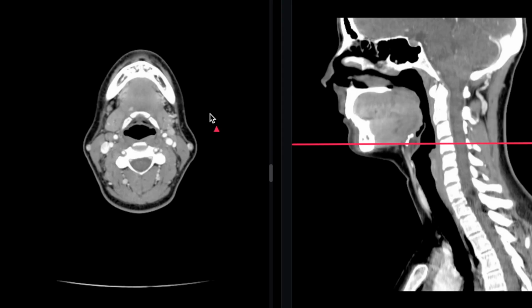I keep talking about this bifurcation because it's an important clinical correlate associated with it. The blood flow to the brain is largely, it's one of the greatest supplies is the carotid artery. And at the bifurcation, there's a lot of blood flow turbulence. Anywhere in the body that a vessel bifurcates or branches, it causes a lot of turbulence in blood flow. So this turbulence can actually damage the blood vessels and predispose you to developing atherosclerosis, and that atherosclerosis can cause stenosis or narrowing of those blood vessels.